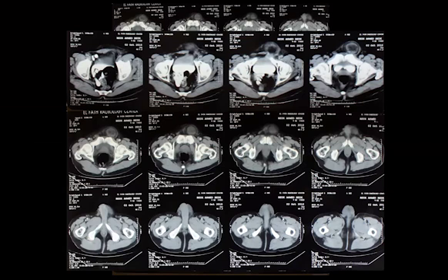Again, this is an area that is present in front of the pubic bone. This is the location of the hernia. You can compare to the other side. It is not there. And you can see that the bladder is probably being pulled into the hernial sac. I think this contains a bit of fluid and air, to my mind. It may be omentum. This is most probably a hernia.